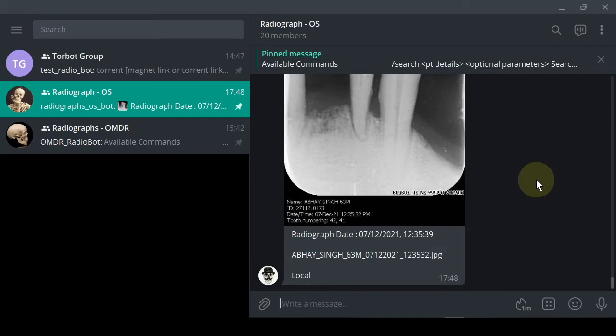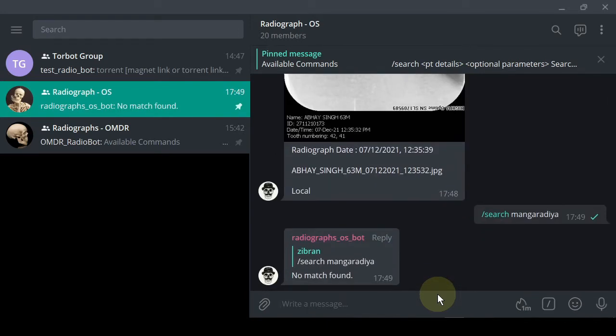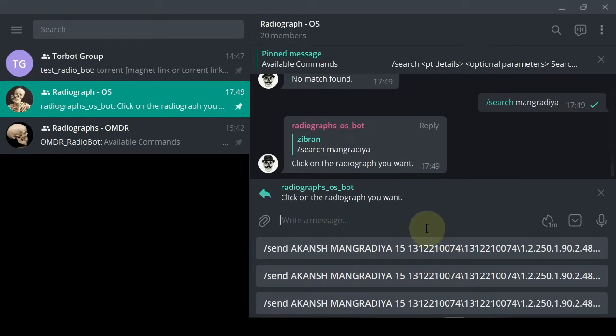Okay, so now there are times when we have a lot of positive results, like if I do search, I already know what results are going to come. Just for demo purpose, I'm using this term. Now the patient's surname is Mangradia. It is a unique name. Okay, the spelling mistake was there, so search Mangradia. So we see 3 positive results.